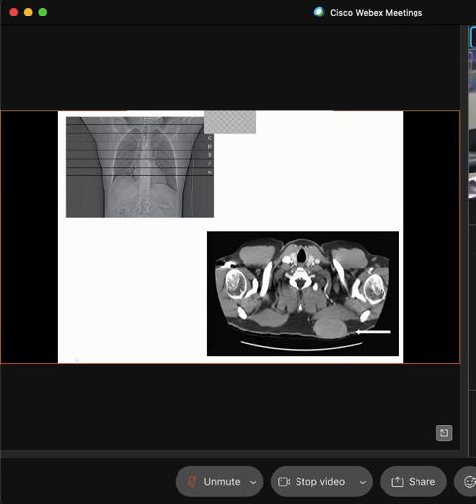So right here, we have a humerus. We have glenoid cavity. We have clavicle. We have trachea. Right humerus, left humerus. This is an axial image. Okay? This is an axial image.